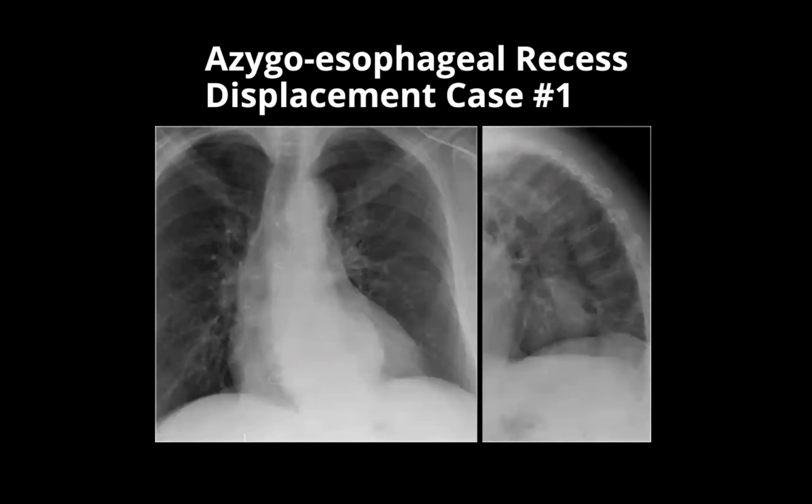So let's look at further cases. This is a companion case because it just looks like the first case I showed you. Look at that retrocardiac opacity. And when you follow that esophageal line closely, you see it actually bulging. On the lateral view, if you have it, it's really nice to always look at it. It really helps you look at the abnormalities and gives you more insight into it.